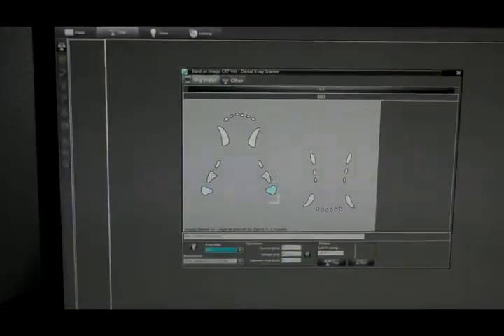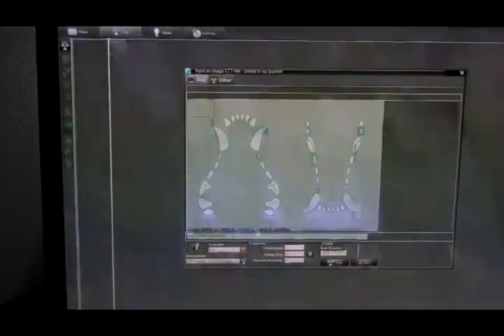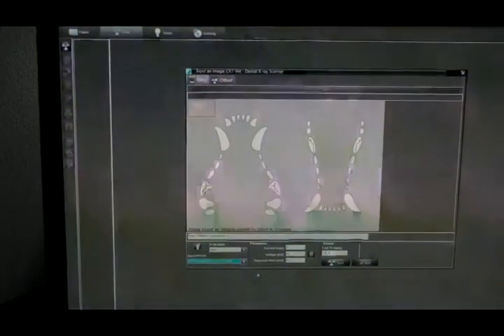You also have puppy, where you can choose as well. At the bottom here, to go back, just press here and it goes back to normal. You also have different resolution modes, but the recommendation is to use 25 line pairs. Choose a tooth and then press input.